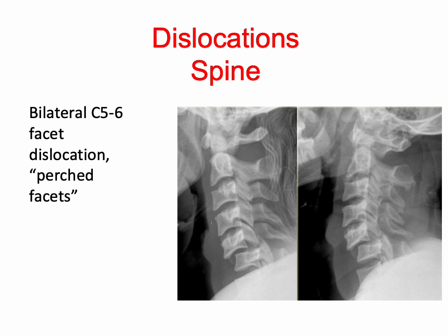We'll talk about the spine more in the dedicated spine talks, but here we've got a dislocation of the spine. At C5-6, we have anterior dislocation or subluxation of C5 on C6, and we can see the facet joints, which normally sit nicely on top of each other. The C5 facets are perched on top of the C6 facets, and obviously you'd be concerned about potential cord injury, because your cord space goes from this to not very wide.